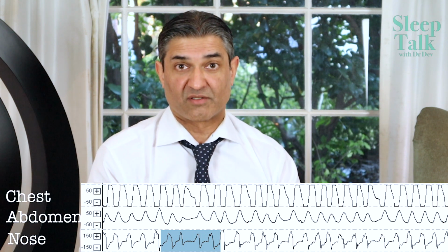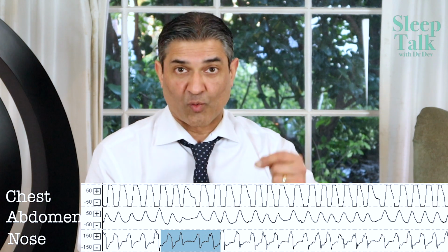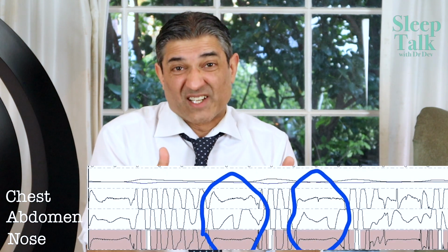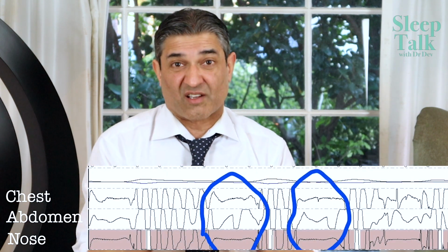The next part of the sleep analysis is the breathing. As you can see, you've got the nasal, the chest and the abdomen signals. The up, down wavy signals denote breathing in, breathing out, breathing in, breathing out. So when they're stopping breathing, there's a horizontal line that really means no breath is going into the lungs.